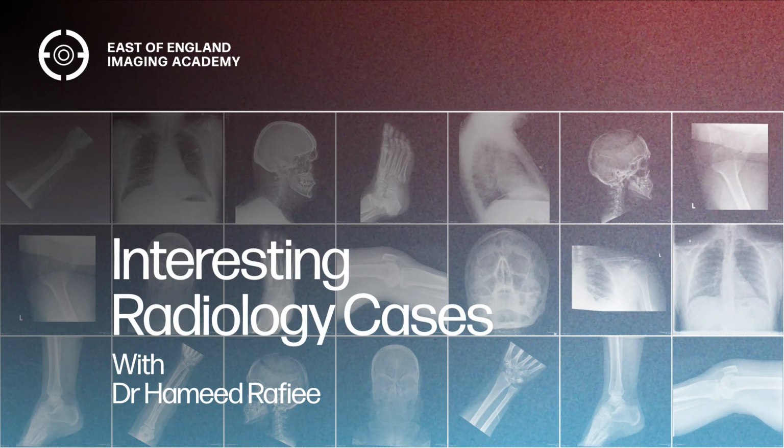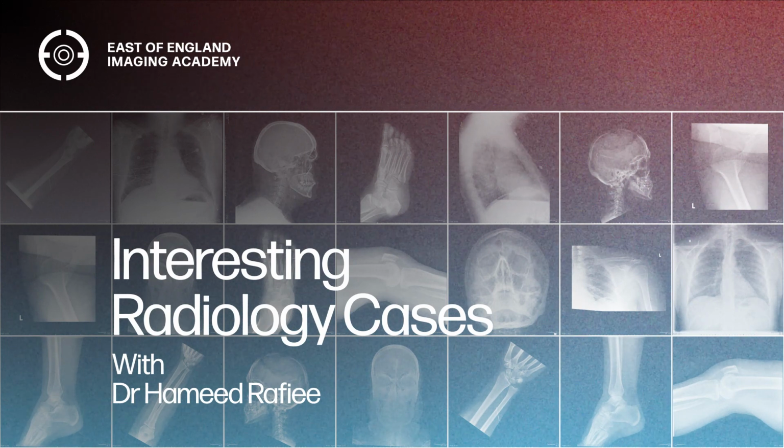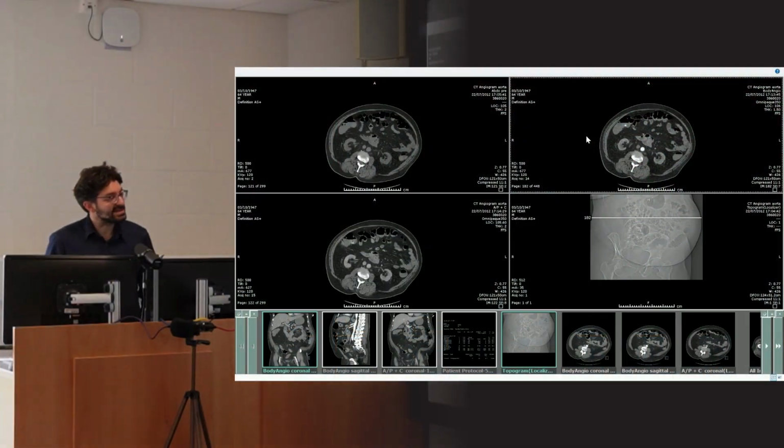I'm going to show you some interesting cases and also teach you a little bit about how to look at CT scans, which I think will hopefully prove very useful to you guys.